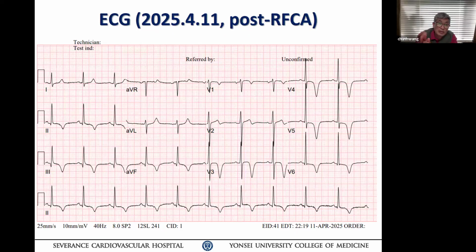Well, it's a supraventricular tachycardia. There you go. In your tachycardia, basically the T wave is concordant with the R wave. Now suddenly your T wave is an inverse axis in 2, 3, aVF and the lateral precordial leads. So in a normal ECG, your R wave goes with a T wave, either way. But what you need to pay particular attention to is how this T wave looks. That doesn't look like a waterfall T wave. They're symmetrically deep. Can you see that? Especially V4, V5, V6. Is this a normal T wave?